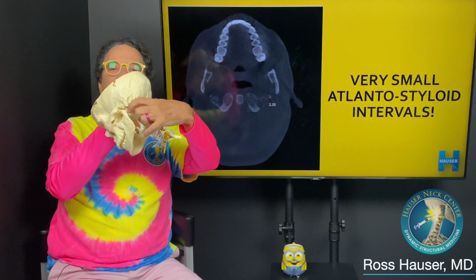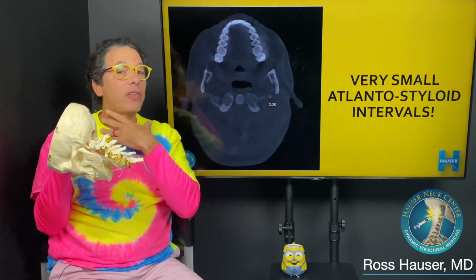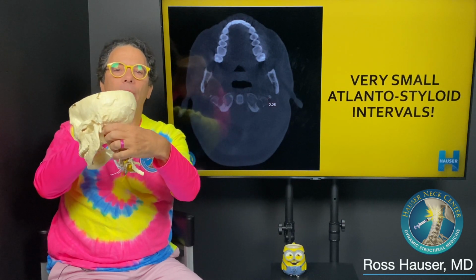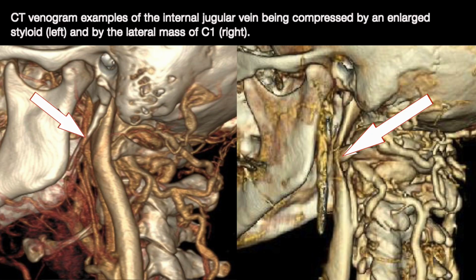So the jugular vein in many people who have an elongated styloid, including me, has to go between the styloid bone and the atlas. The normal jugular vein is 9 to 10 millimeters by 9 to 10 millimeters. So ideally, there needs to be 9 to 10 millimeters of space.